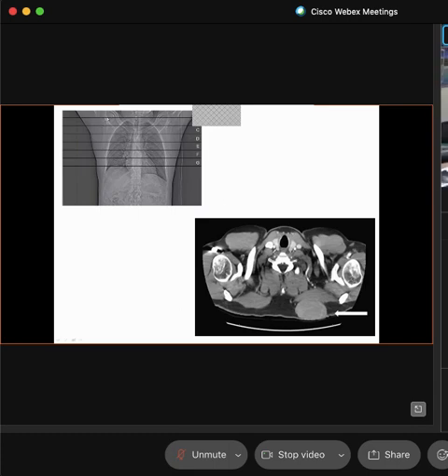And if I go back and I look at what type of axial image this could be, chances are it's going to be which one? A, B, C, D, E, F, or G? A or B? I like A. Because I don't see what? I don't see any lungs. Lungs are going to look very, very dark. Good job, guys.